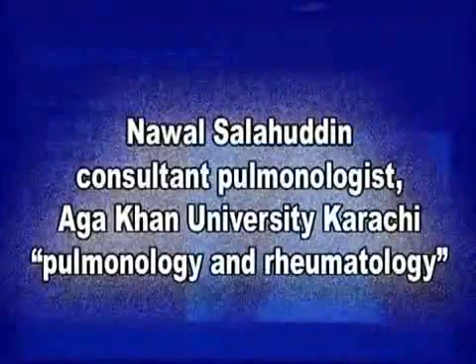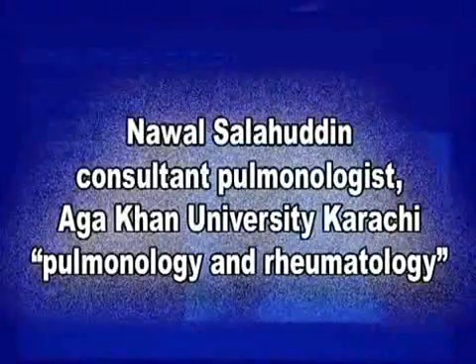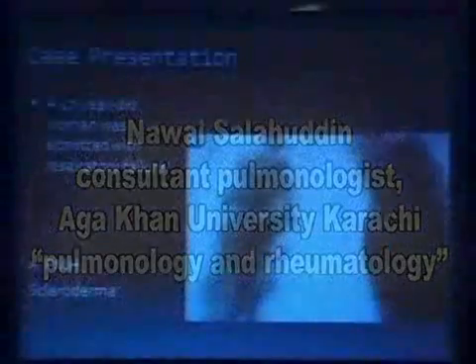that you can see that there is a large amount of thickened interstitium visible, mostly on the right side, but certainly present bilaterally. She had a past medical history of scleroderma that she'd had for the past 10 years and had been on disease-modifying agents.